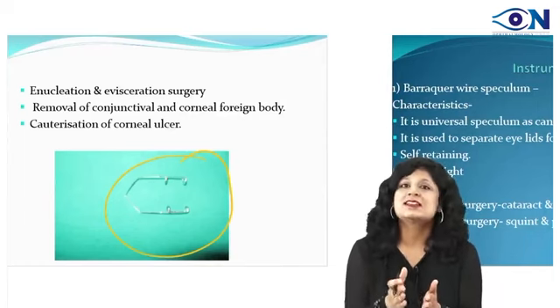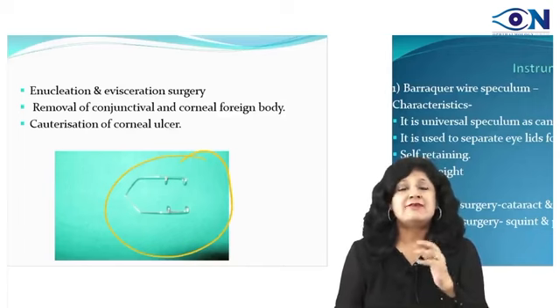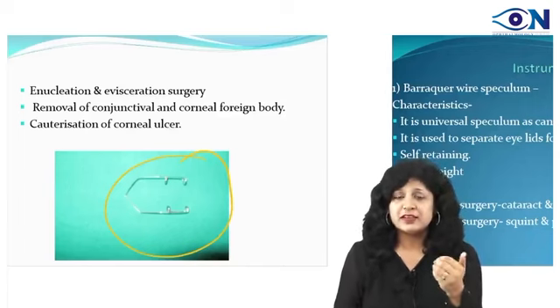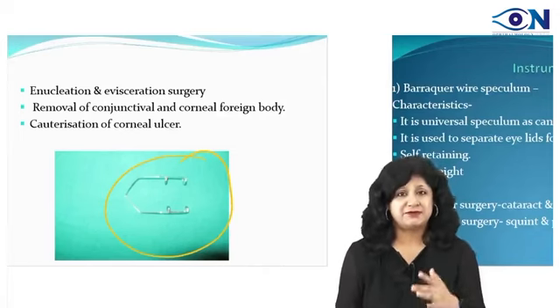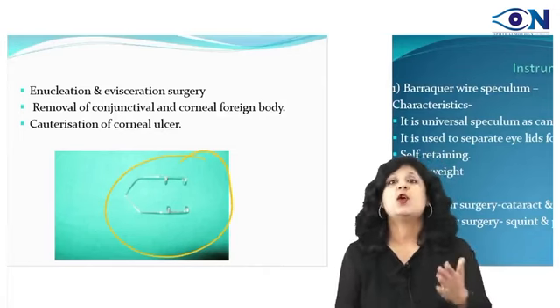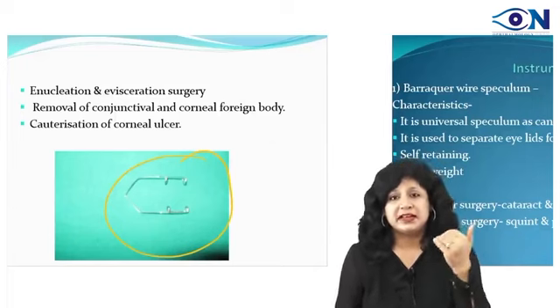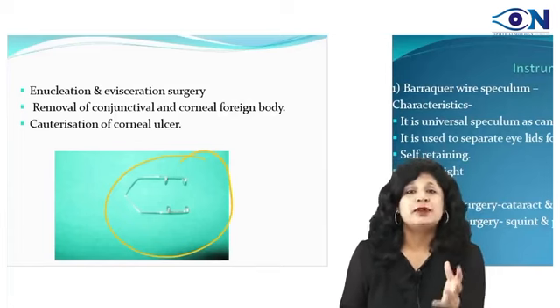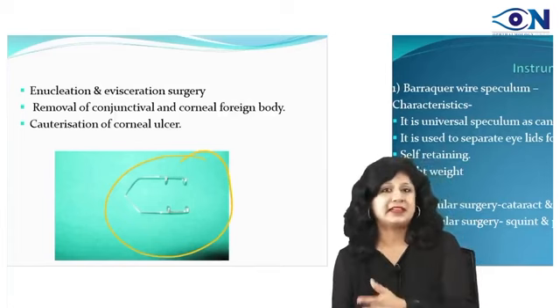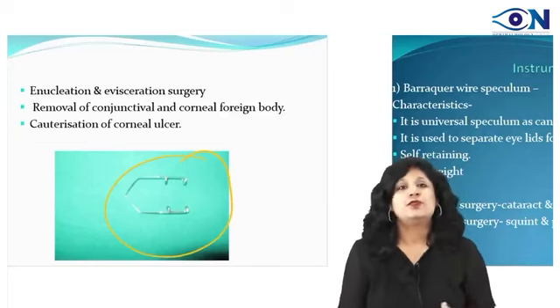And I think this is one of the very common uses of this speculum, because every day when you are there in the OPD, there must be some patients, and everybody who is posted in the OPDs or who has already passed or maybe doing the internship posting in the ophthal will agree with me that foreign body is one very common case that you get in the ophthal OPDs. So that time also we use it.